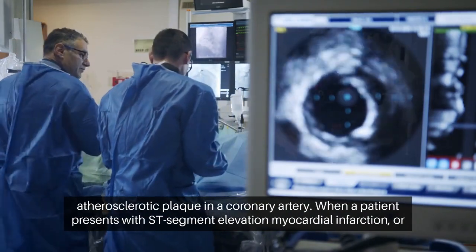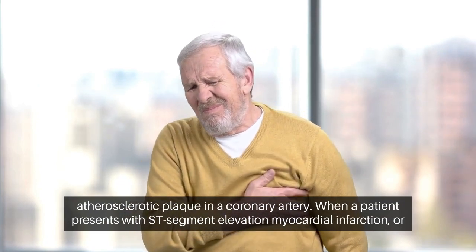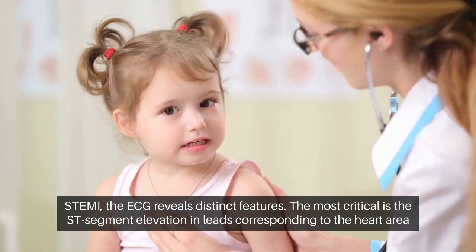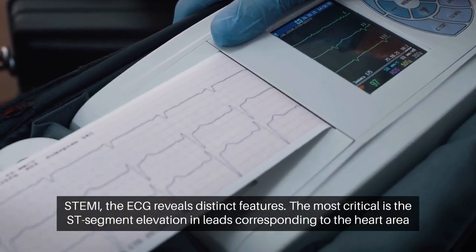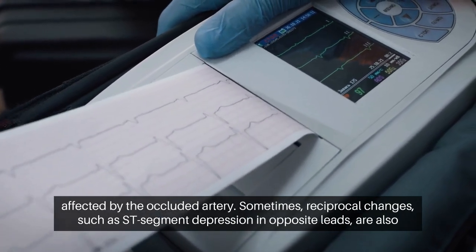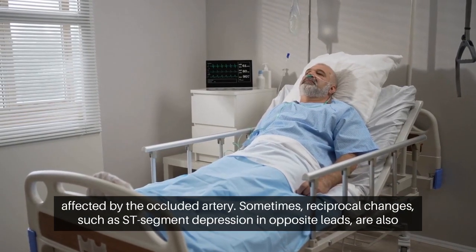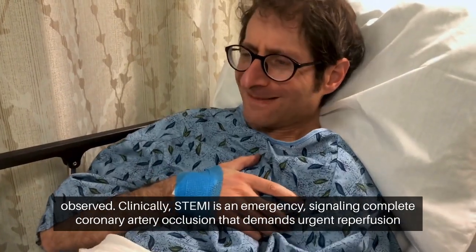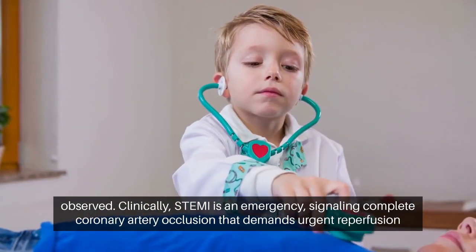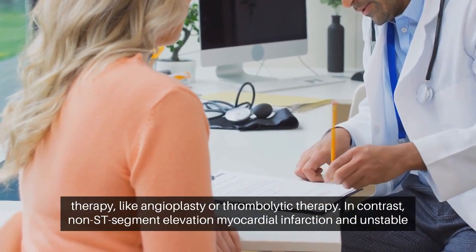in a coronary artery. When a patient presents with ST segment elevation myocardial infarction, or STEMI, the ECG reveals distinct features. The most critical is the ST segment elevation in leads corresponding to the heart area affected by the occluded artery. Sometimes, reciprocal changes, such as ST segment depression in opposite leads, are also observed. Clinically, STEMI is an emergency, signaling complete coronary artery occlusion that demands urgent reperfusion therapy like angioplasty or thrombolytic therapy.